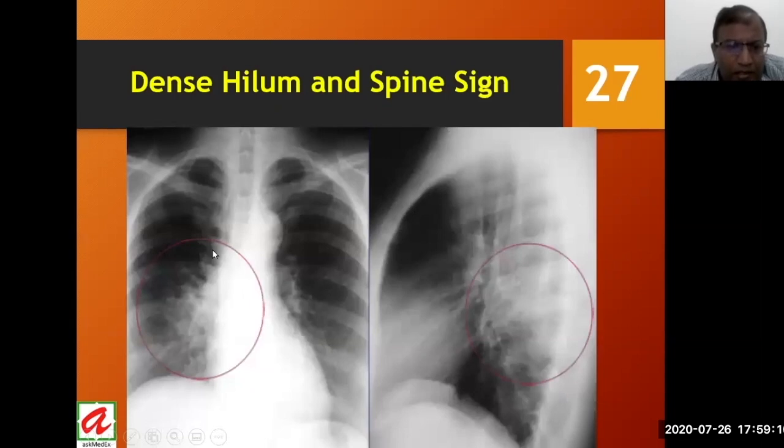Now, in this radiograph, we see an ill-defined radiodensity all around the right hilum. I can see a tapering pulmonary artery, but all this doesn't appear to be a mass. I'm not sure whether it is lymphadenopathy, is it pneumonitis, what else it could be.